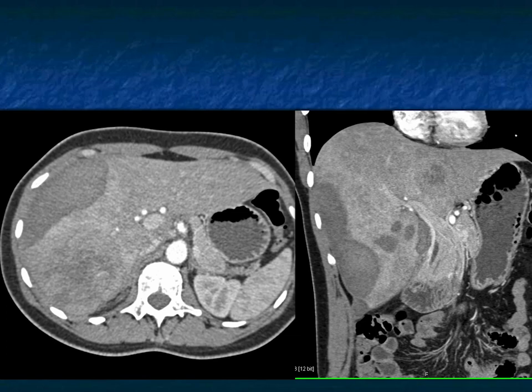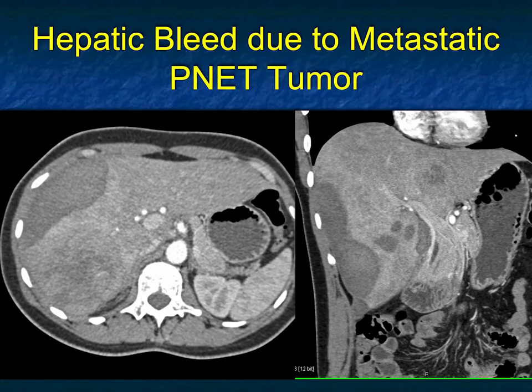But invariably, in my mind, the presence of a bleed in the absence of trauma, and surely when there's a mass present, is hepatic adenoma, particularly when the liver is not cirrhotic, as is the case here, and hepatoma is number 2. And multiple masses in the liver, hepatic adenoma is a good thought. And this was due to a metastatic neuroendocrine tumor. I was sure, positively sure, these were multiple hepatic adenomas. I didn't think it was hepatoma, so hepatic adenomas.